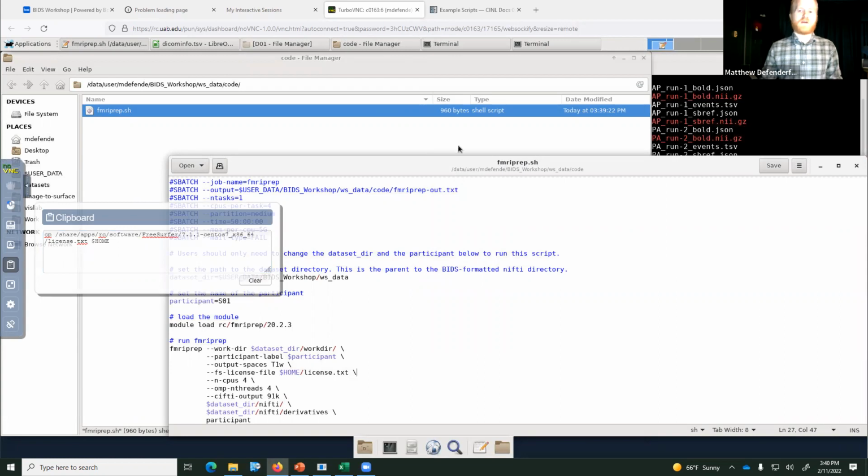So you're going to copy the FreeSurfer license file from FreeSurfer 7.1.1 to your home directory. It doesn't matter which license file you have, like you can get it for version 6.0 or 5.3 or whatever. It's all the same license file. One license file will work for all versions of FreeSurfer. So don't worry about which one you actually copy paste here. It'll be fine.